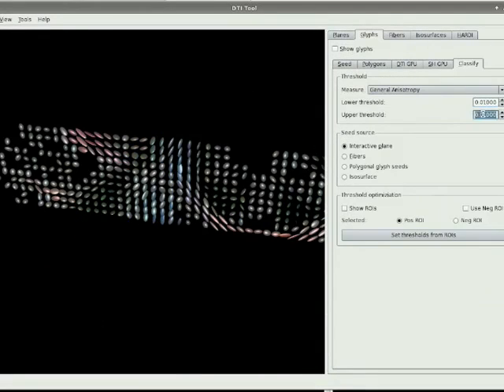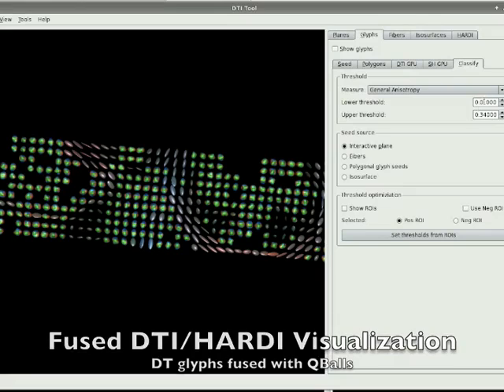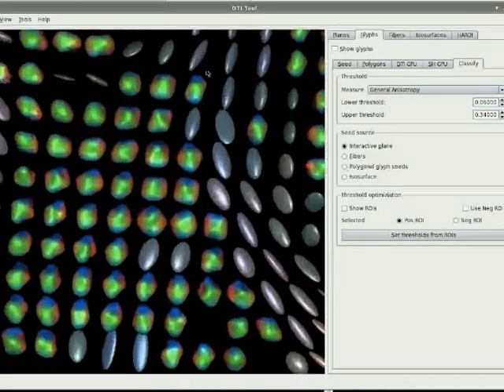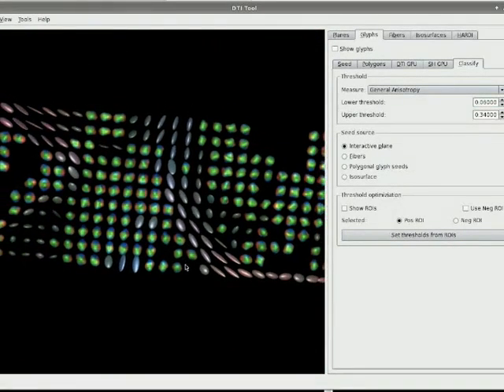We can furthermore disable the fibers and look at the local glyph information. At the moment, this information changes by changing the threshold of our classification, which means that the non-Gaussian profiles appear and disappear depending on the threshold tuning.